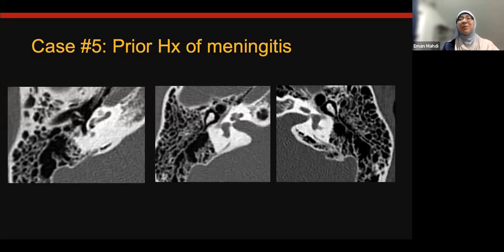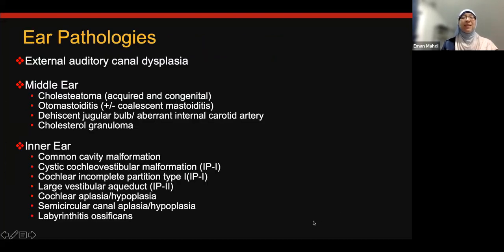Okay. Again, we'll go over these cases. Temporal bone disease is always hard, even just the temporal bone anatomy. So it's totally understandable. There is no pressure, especially for the pediatric entities. That's definitely hard. So you guys are doing a good job. This is the last case, and these are the pathologies that we will go over, and you will see some of these cases. By the end, we'll also set the diagnosis for each case, just so it sticks in your head.